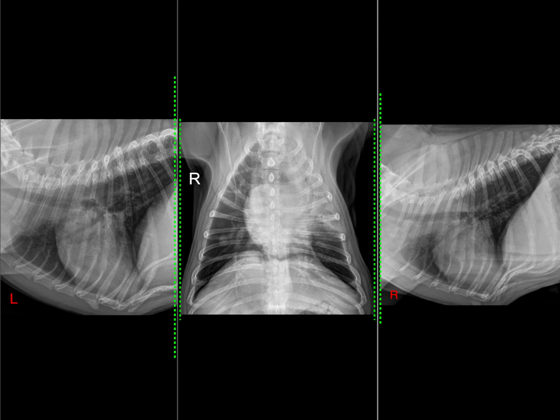I am Manuel Pinilla, your radiologist on demand for today. Today's example is a 3-year-old female French Bulldog presenting with acute onset tachypnea and pyrexia following episodes of vomiting. Once you have reviewed the radiographs using your systematic approach, then you are ready to watch this video.